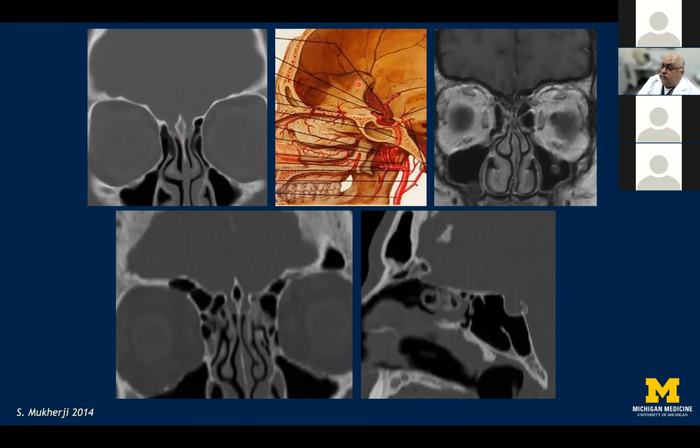So remember that the anterior and posterior ethmoidal foramina are not usually visualized on routine evaluation of the skull base or paranasal sinuses because they are so small. However, the exact position of the ethmoid roof is important for us because of the attachment of several other structures, like the plates of the uncinate process and the ground lamella, which is the connection of the middle turbinate to the anterior skull base.